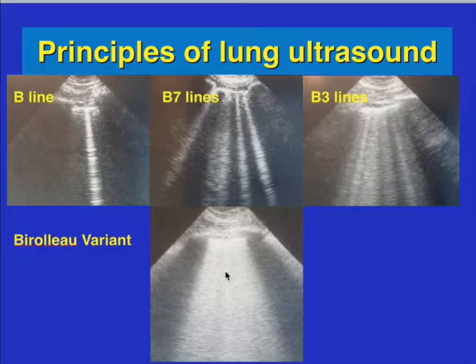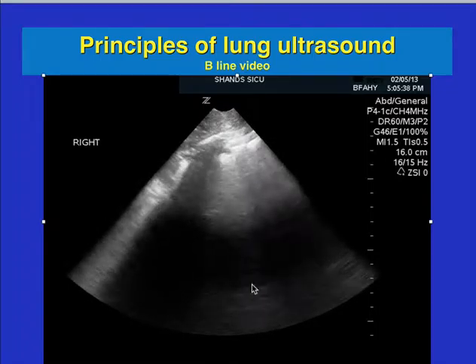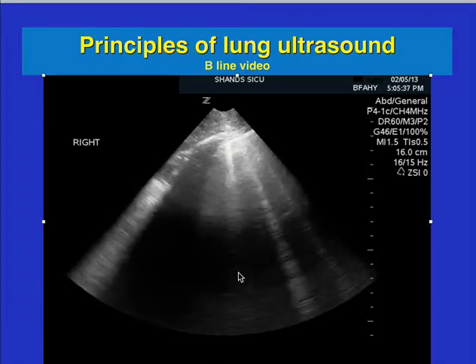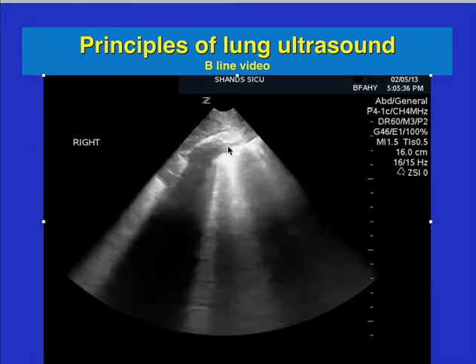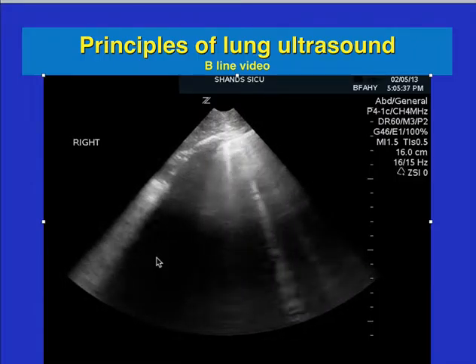They've actually done multiple studies also showing disappearance of these lines when patients are in pulmonary edema and are getting dialysis. So it's been proven pretty well that they're very accurate in identifying pulmonary edema. Here's an image of the B lines that you see. You can see that they're sliding. This is the lung. This is a rib with a shadow.